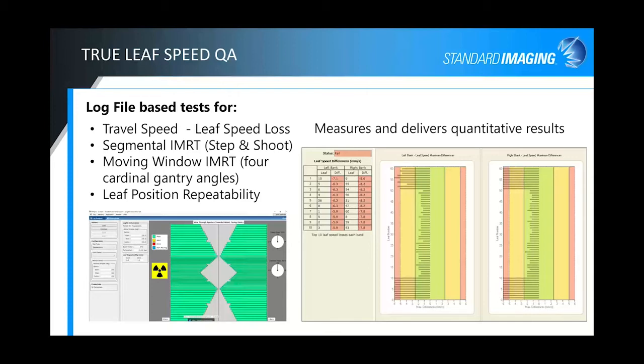And we also do it, like I said, for step and shoot. We do it for moving window. We do a repeatability test as well. So there's a number of different log file based tests we have for PIPSpro.